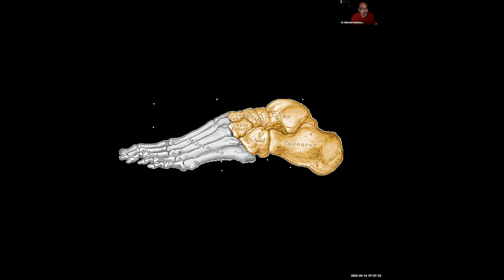And we as radiologists are important in the workup of these hindfoot fractures. As I mentioned, the hindfoot, talus and calcaneus, these two bones basically span the tibiotalar joint to the transverse tarsal joint, as we see here.